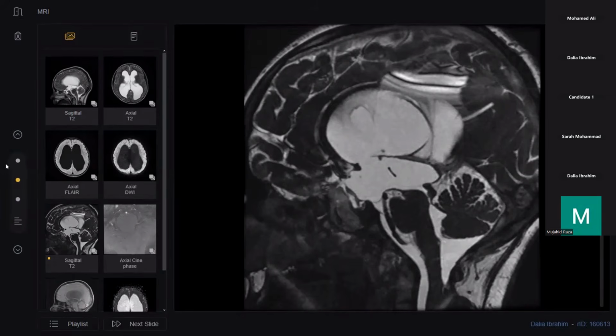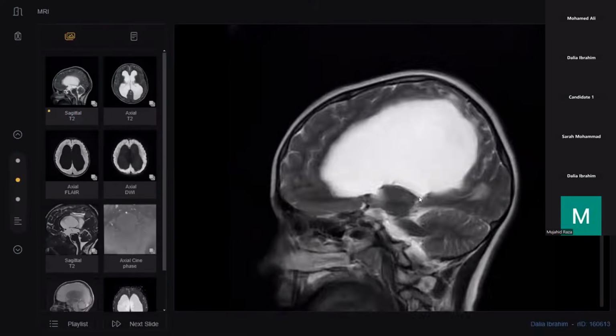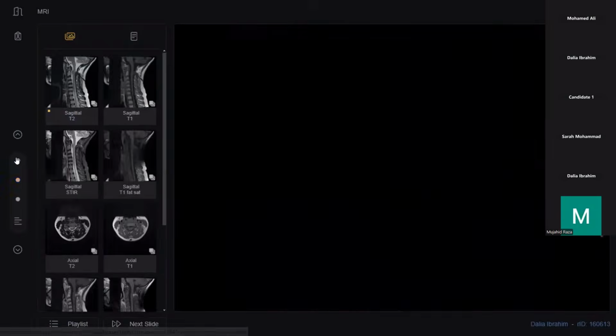Okay, so we have seen the abnormality here, which was the start of the story. We have a skin opening, we have a sinus tract which is epithelialized, leading to retained secretions and superadded infection, which had spread to the spinal canal, leading to meningitis, which had spread to the brain, leading to the marked hydrocephalus. Okay, in this case.